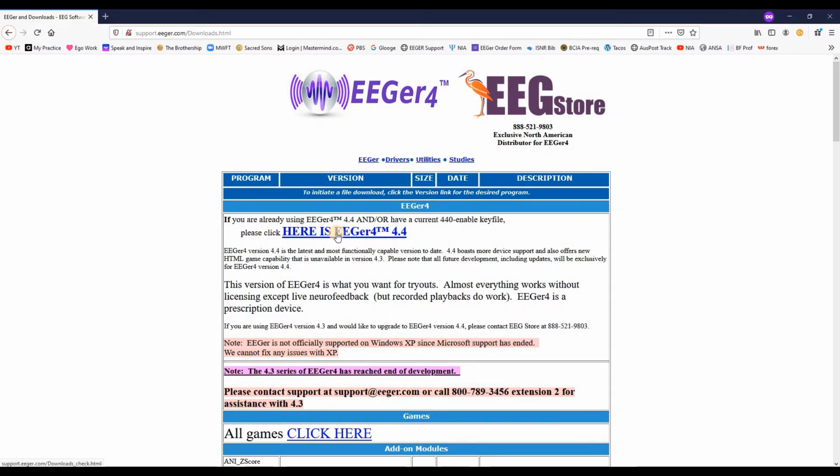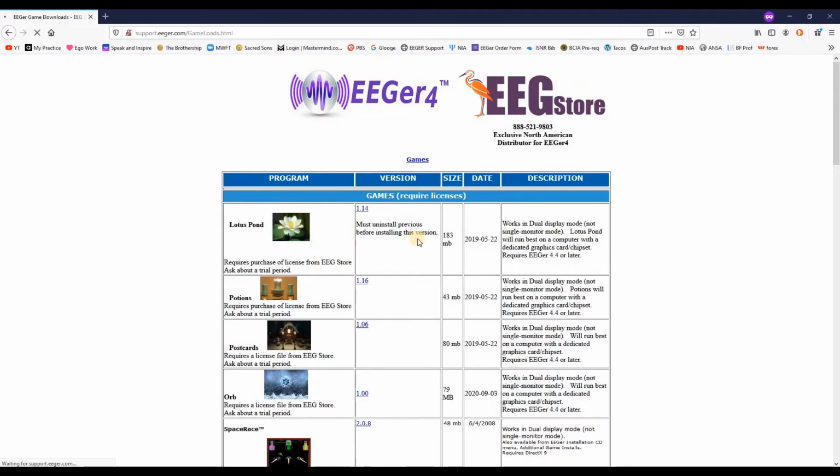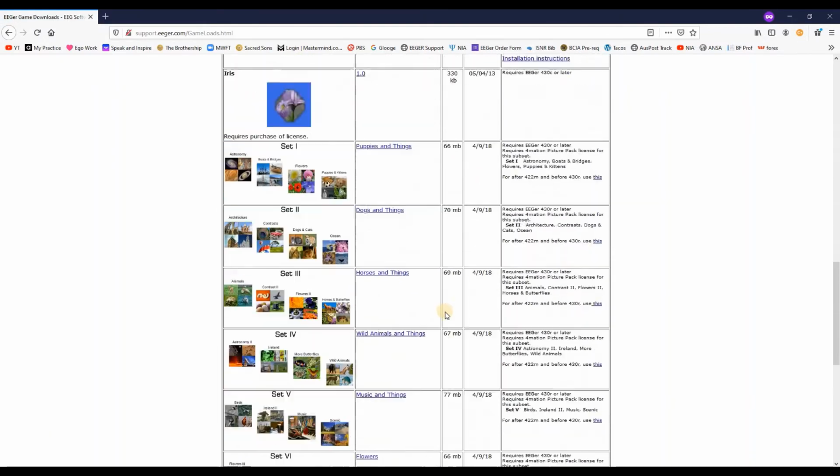That's where you would go to find the latest version of EEGer, to get the update files, that sort of thing. We're not covering that in this video, but that's where you'd go for that. And then for games, you click here. And here you have the list of all the available games.